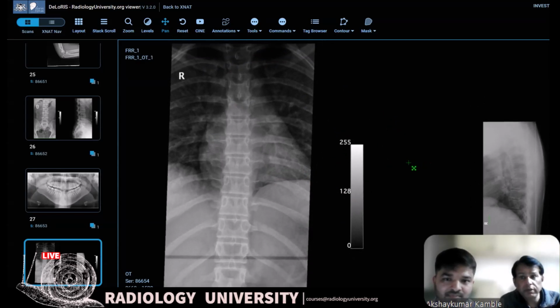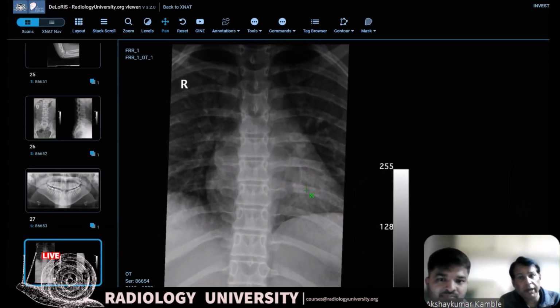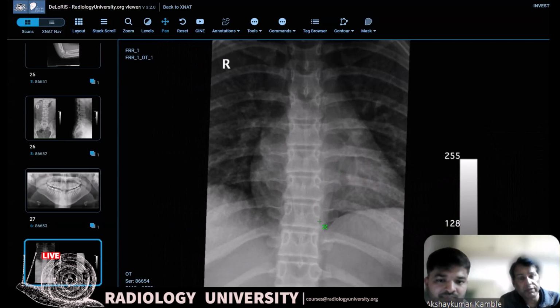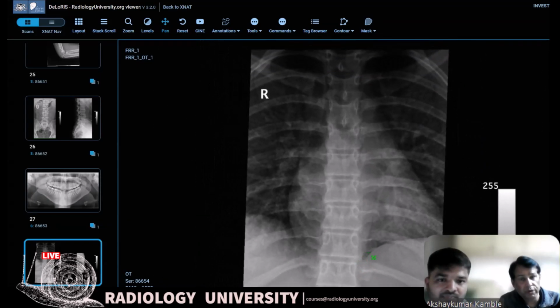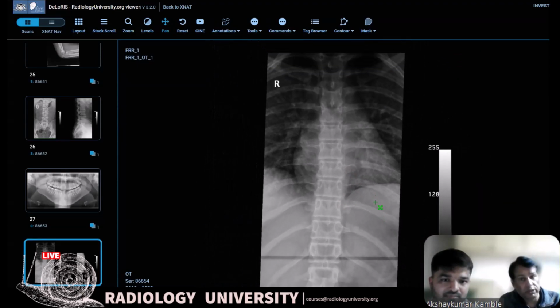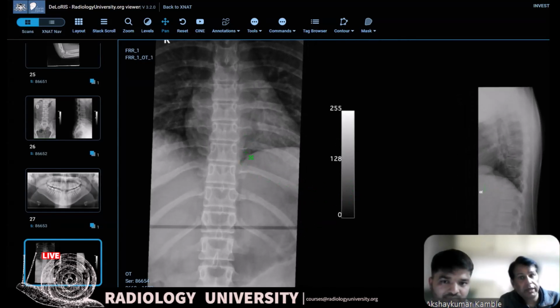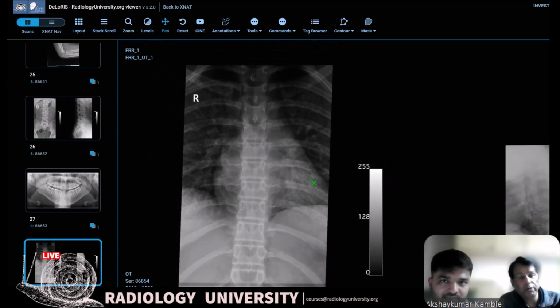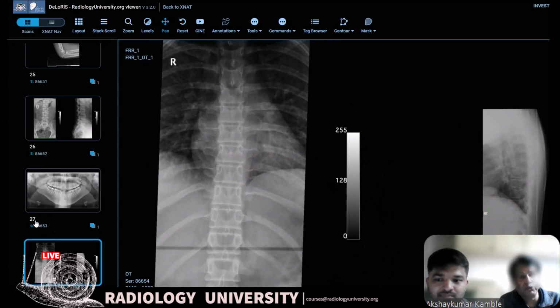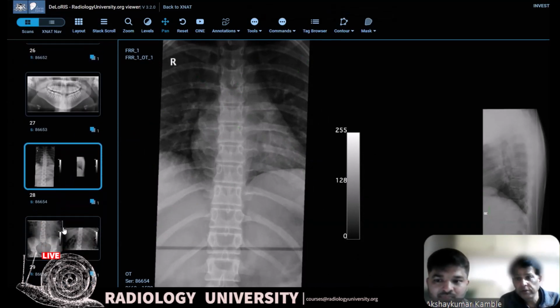Again, a normal spine. Number 28. Alignment okay. Pedicles you can count okay. The ribs are fine. You look behind the heart. These are your review areas when a spine is given: paraspinal shadow, calcification, retrocardiac, posterior costotransverse articulation, fractured ribs in the back, and displacement and height. They all look normal. Any fusion or something on the lateral view? This is normal. So moving on.